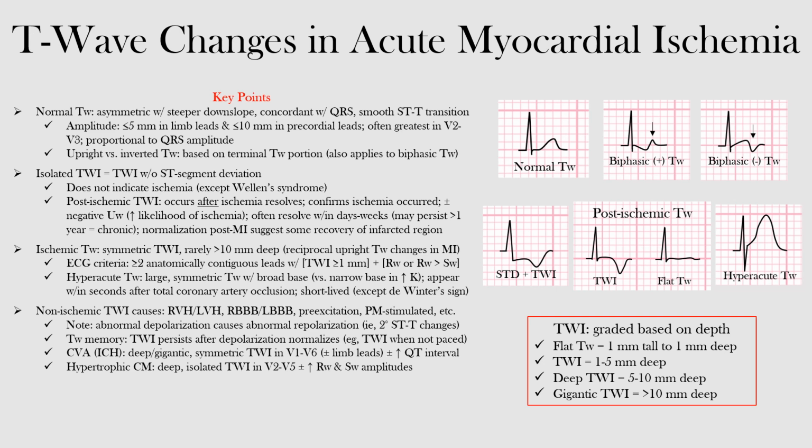The T-wave is typically positive in just about all leads, except for leads aVR and sometimes V1, in which it is negative, and so is the QRS complex, meaning they are still concordant and normal. Okay, so again, normal T-wave, here's our T-wave. Notice that it's positive, upright, in the same direction as a positive QRS complex. Both positive or upright, or mostly positive, so that's what we mean by concordance.